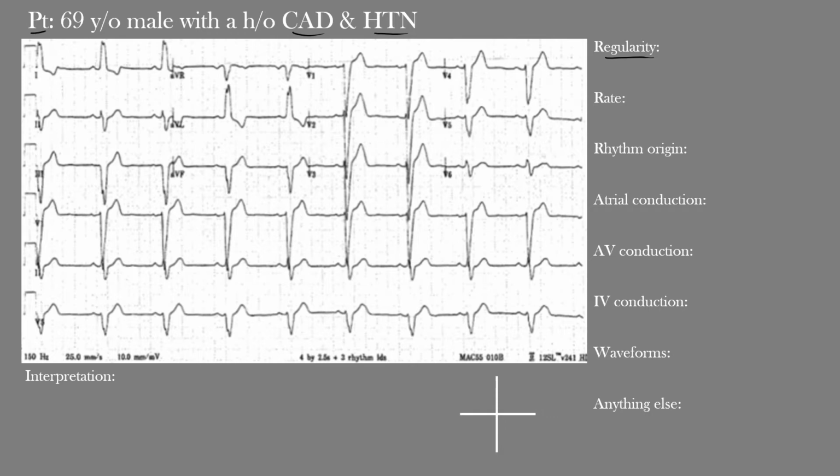Now what I want you to do is pause the video and take a few minutes to go through it yourself. When you're ready, start the video and we'll go over it together.